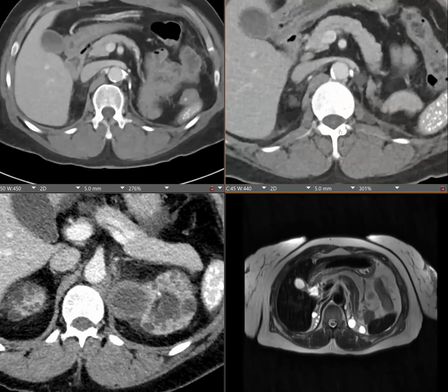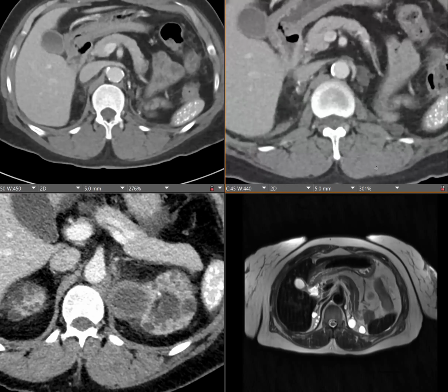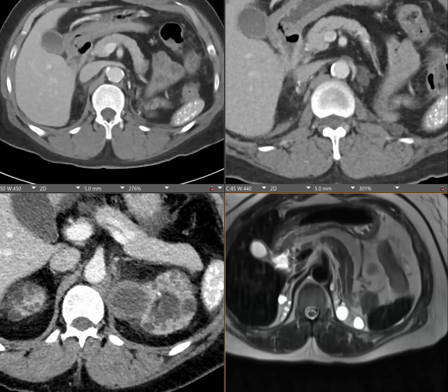Probably. So I'm just showing this CT 3 years before this MRI. You can see the right renal bed had probably one, and then this is 1 year after that. It's increasing in number. You can see here, it's increasing more in number and also size. Such a weird distribution too. Cool. Okay.